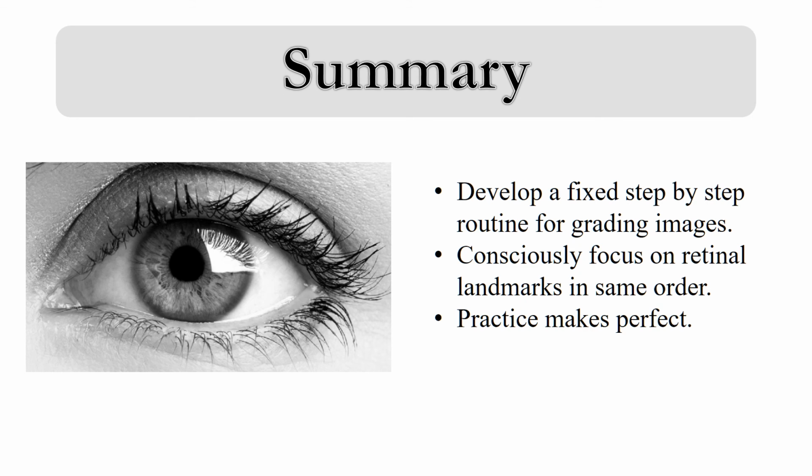In summary, develop a fixed step-by-step routine for evaluating and grading images. Consciously focus on all the retinal landmarks in the same order for each image. Using this short exercise as a beginning, the adage that practice makes perfect also applies to screening retinal images for diabetes-related retinopathy. Triage and referral protocol will be discussed in Module H, entitled Setting Up a Screening Program.